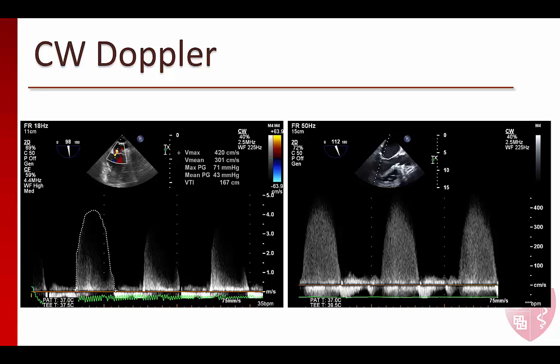The left-hand image shows the continuous wave Doppler appearance of mild MR. Notice that the continuous wave signal of mild MR is faint and parabolic with an incomplete envelope. Contrast this to the dense envelope seen on the right. In severe MR, the CW signal density will appear dense and closer to that of antegrade flow, as a greater percentage of flow is regurgitant.